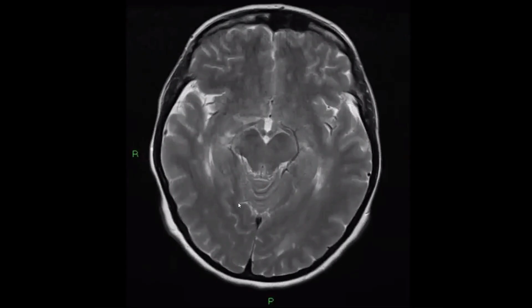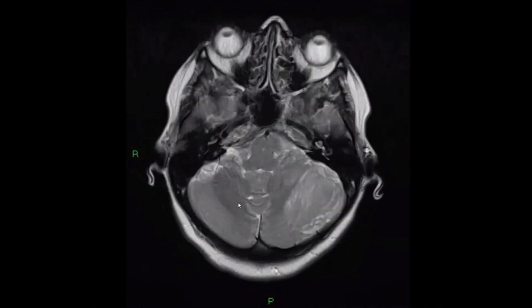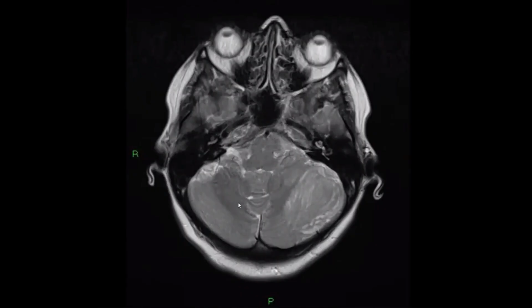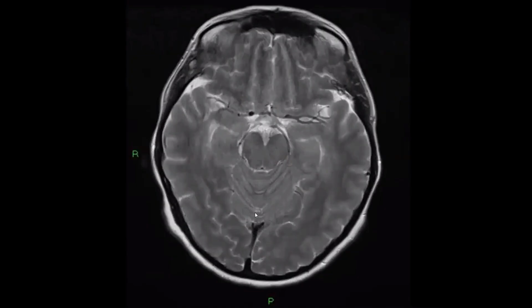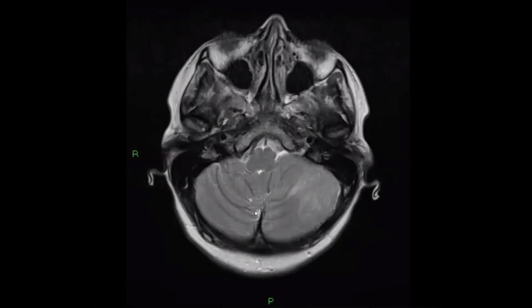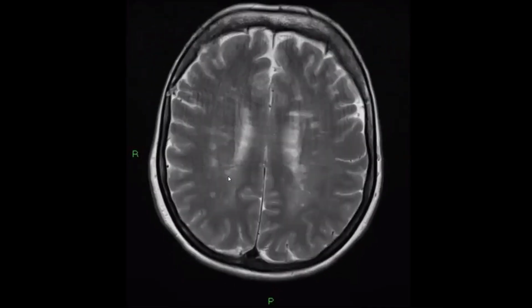Yes, very nice. So we have here multiple sclerosis with coexisting dysplastic cerebellar gangliocytoma. Gangliocytoma, not ganglioma. Okay, take care of this point. And the strong association with this mass lesion is Cowden syndrome. Yes, Cowden syndrome, and you should search for any hamartomatous affection elsewhere within the body or the bowel, and there's also an association with breast cancer and also thyroid cancer. Very strong association. Okay, thank you so much.